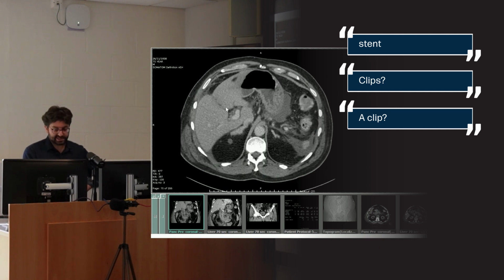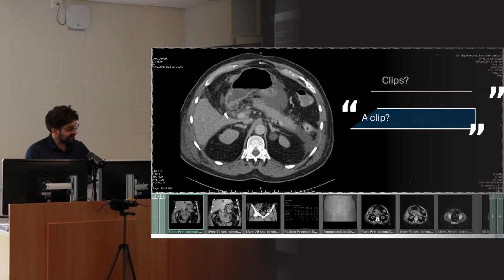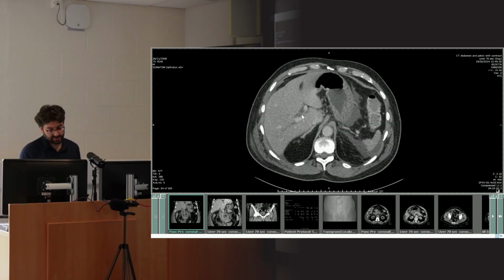Because what can't we see? We can't see the gallbladder. What can we see in the gallbladder fossa? We can see some metal. Therefore, these are cholecystectomy clips. And that's basically what they are. So those patients had a cholecystectomy. So clearly they had gallstones before.